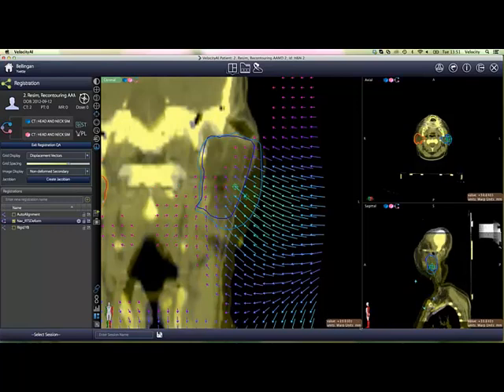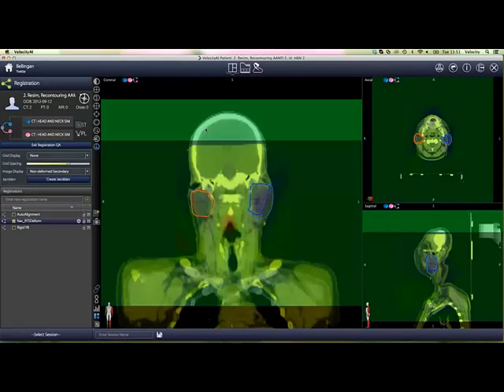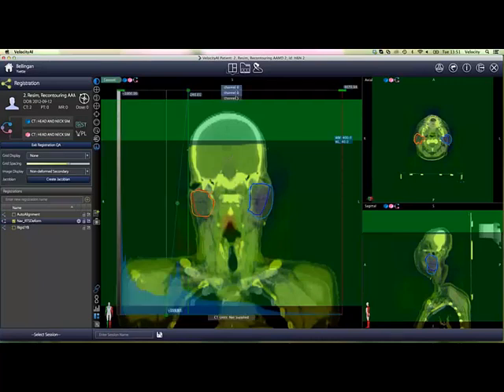And what we then do is apply the Jacobian histogram. So we create the Jacobian and we have a look. As I said, what the Jacobian does is it gives you the values, explaining whether this structure has shrunk or expanded. I could see that the parotid has shrunk. So anything under 1 indicates that there's shrinkage. Anything over 1 shows that there's expansion.